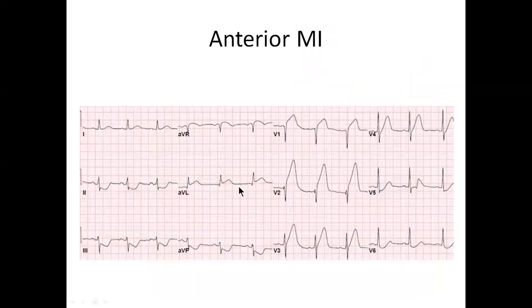Now this is a real ECG. Again, please, you have to go through the sequence when you are looking at an ECG. Don't jump to the thing that looks abnormal. But just now, I'm just going to show what is abnormal. If you look here, this is our baseline, and the ST should have been here, but it's not, it's up. Therefore, we call it ST elevation.